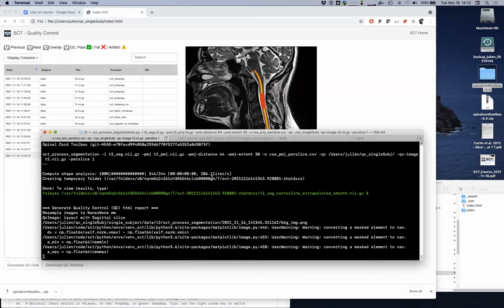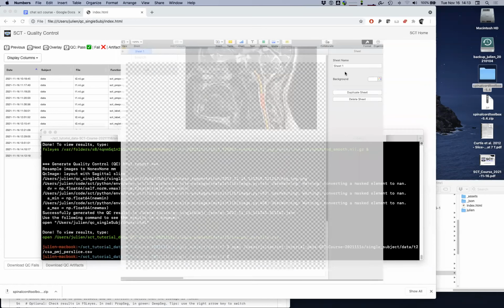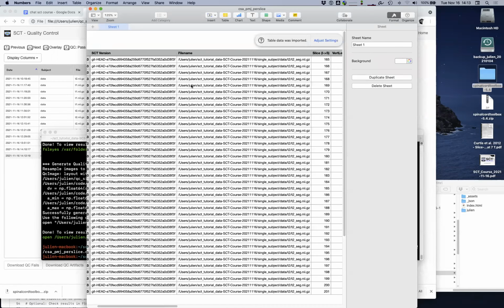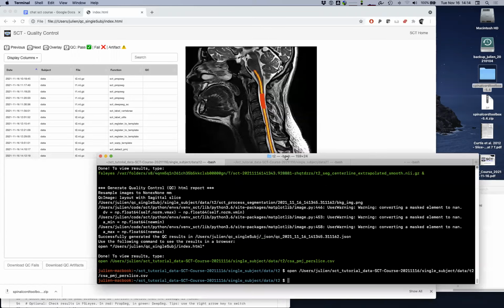It doesn't crash, but now let's see what we get. Wow, it works, amazing. Okay, cool. Well, so here we go. Okay.